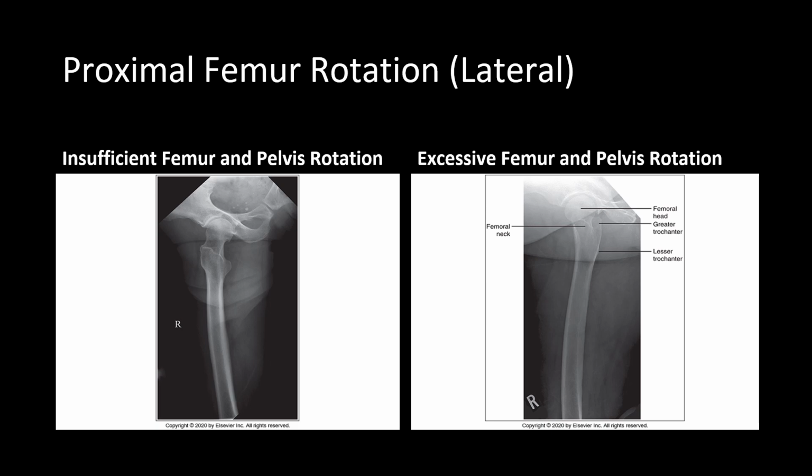Let's take a look at insufficient and excessive femur and pelvis rotation and how to determine which is which.